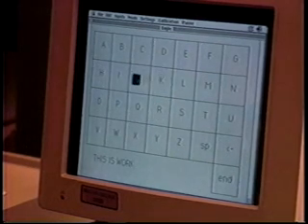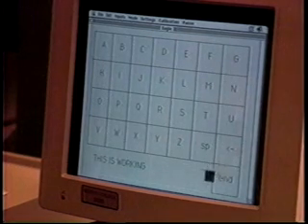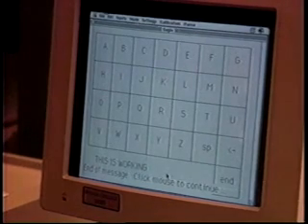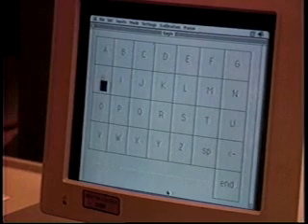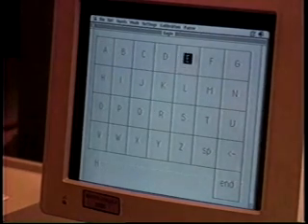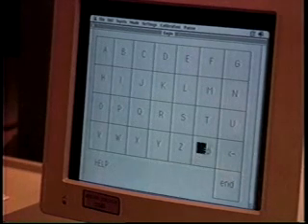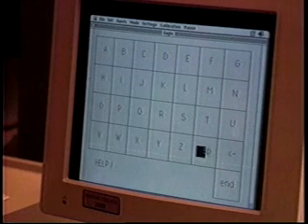If the cursor is kept in a square by the user for a certain period of time, then the letter is added to the end of the message. A space key, a backspace key, and an end of message key are provided on the screen. Basically, the cursor is tracking eye movements. Nonlinearities or drifts in the signal can be corrected by the user with small movements of his head.